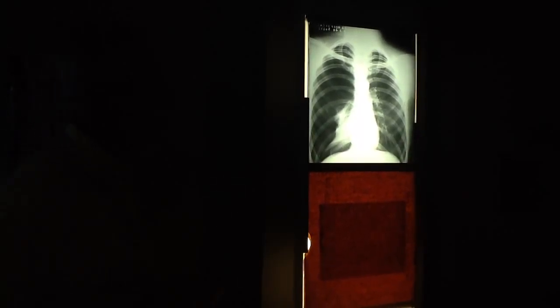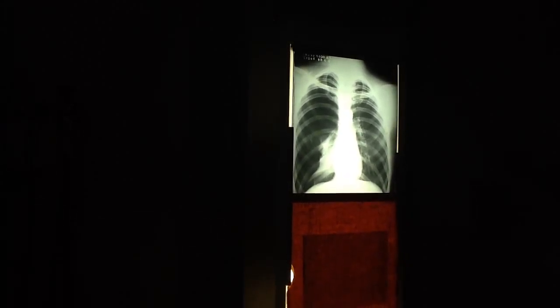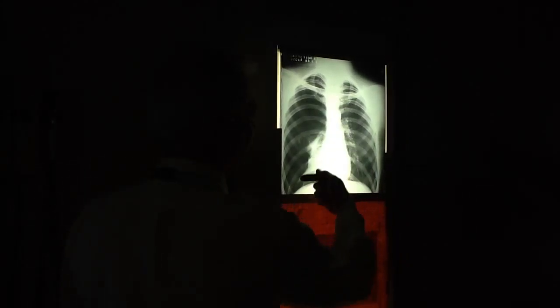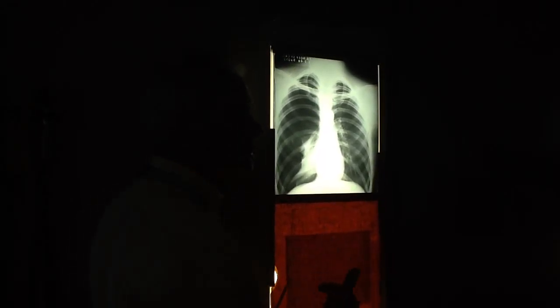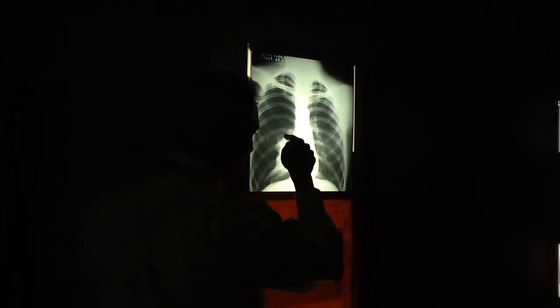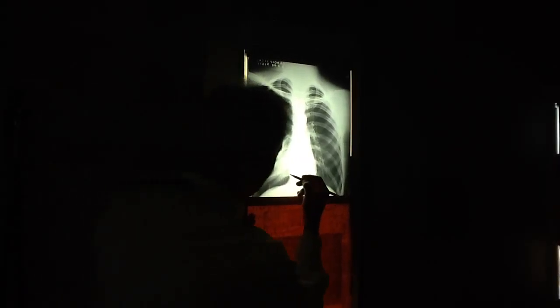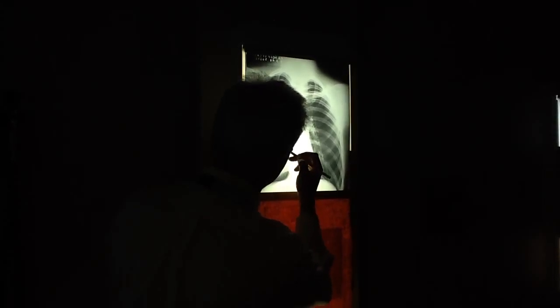Now we have two density changes on this one. Then we'll do this one in just a second, but since we're talking about atelectasis, let's just talk about this one. So what are the two density changes on this one? You have hyperlucency from pneumothorax, and you have water density. Unilateral, widespread hyperlucency, right lung. But then we also have unilateral localized, lobulated, well-defined density, medial right lung base. And it still has a little bit of vasculature in it, isn't it?